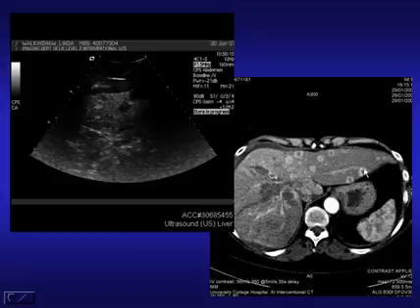We will possibly only get this kind of image quality for a few seconds during one part of the arterial phase. And in CT now we divide it up into early and late arterial phases, but we can never predict exactly which point in time will give us the best image. With the ultrasound contrast we can detect these lesions equally well, but by continuous scanning we're less temporally rigid than we are with CT.